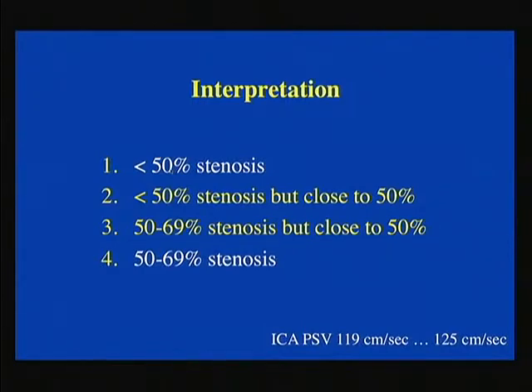So either one is, I think, acceptable, but it has to communicate that that patient does need to be watched more closely over time because we do monitor these stenoses. When they get to about 50%, some recommendations are that you should follow them yearly. Others say 6 months. It really depends on the state where you are. We basically do about every year when you get close to this point.